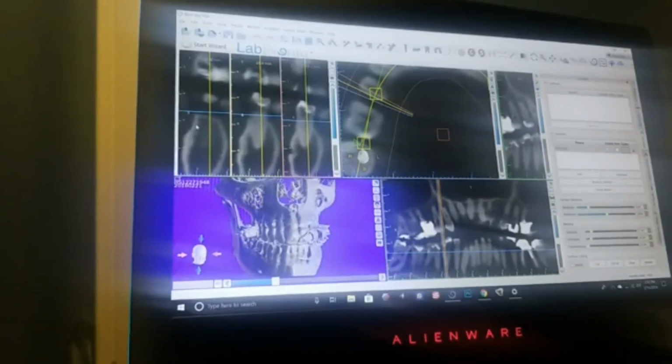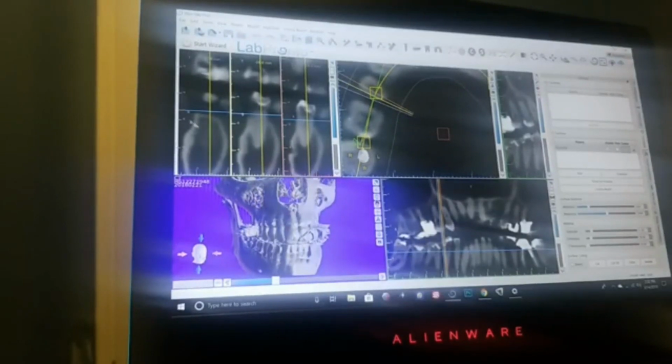So now look at what you're looking at. Here in the axial image, it gives you information about your cross-sectional three lines. You can come down into the panoramic view, same three lines. That's where you're at. We're looking at tooth number 29 right now because I'm looking at the panoramic view and I see it's really pointing out tooth number 29.